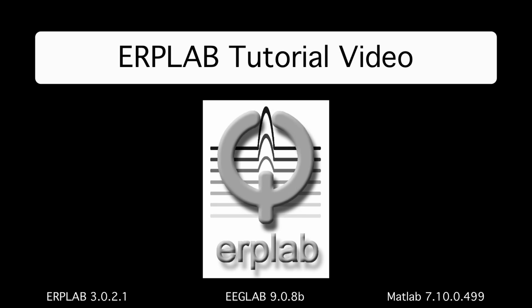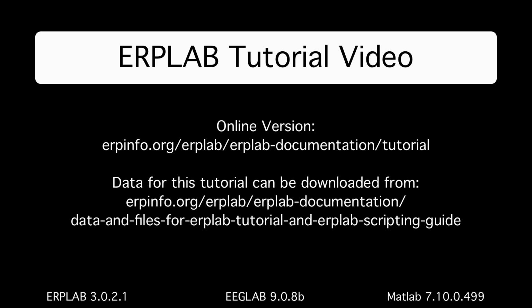In this group of videos, I'm going to go through the basic steps in processing a single subject's data, going from the initial EEG to an averaged ERP, and then doing a few processes on the averaged ERP. This is basically a quick version of the online ERPLAB tutorial, which you can look at on the internet. I encourage you to follow along in the tutorial, which may answer any questions you may have along the way.